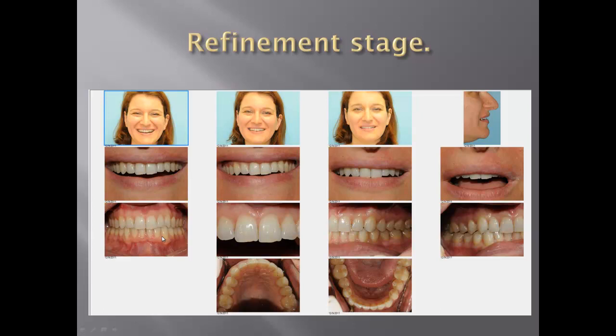But the most important, we can see that the crossbite is eliminated, and the position of her 10 and 11 is in much better shape right now.